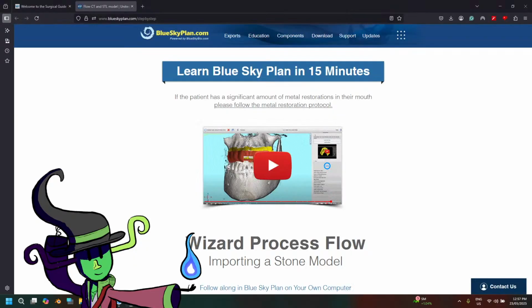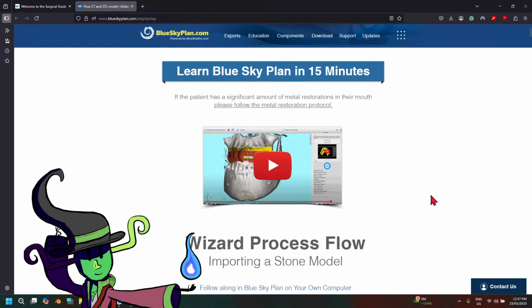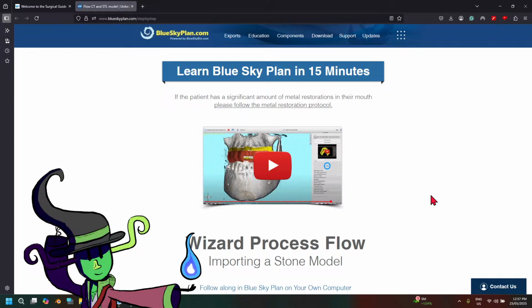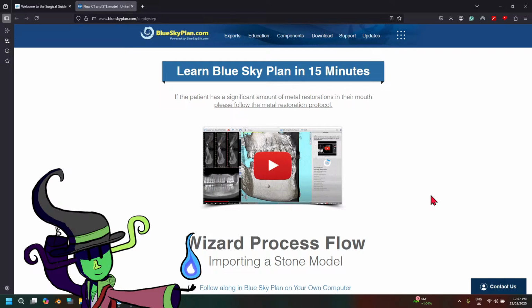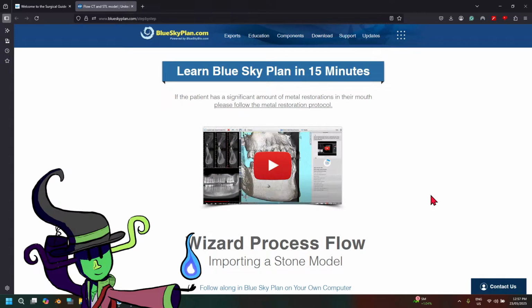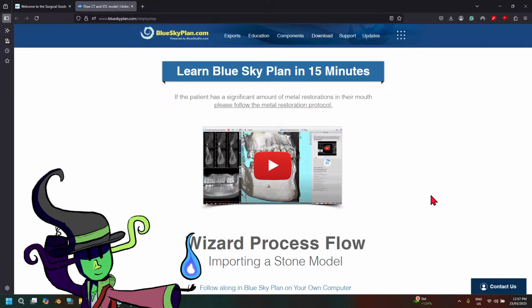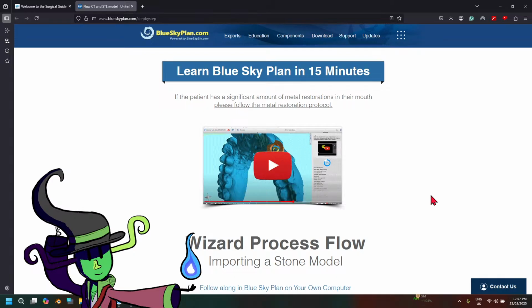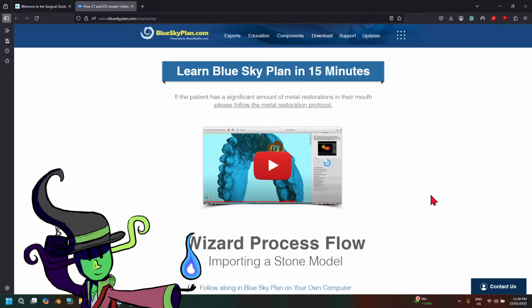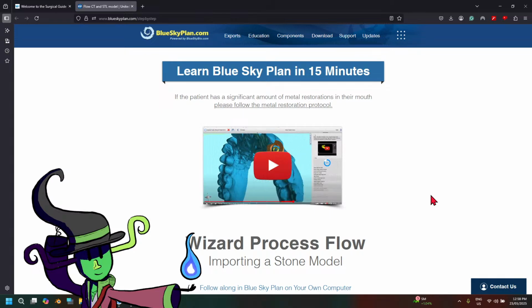I am your host Morgan Ozpin, and today we're gonna be trying something completely new once again. I have once again jumped into a new rabbit hole of skills that I want to try out. And this time it's gonna be something very different yet sorta, I guess, familiar to you guys who have been following me since I've been doing my Blender stuff since 2022. We're gonna be learning how to 3D model in a dental CAD software.